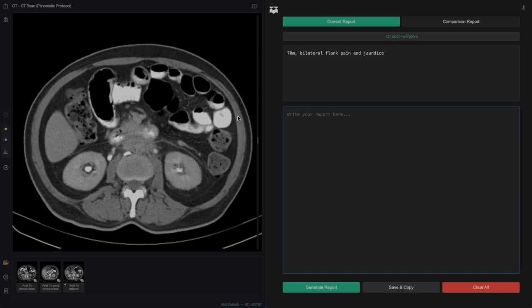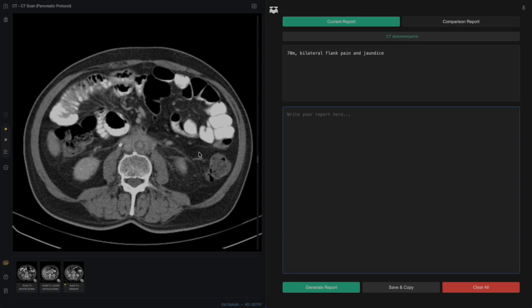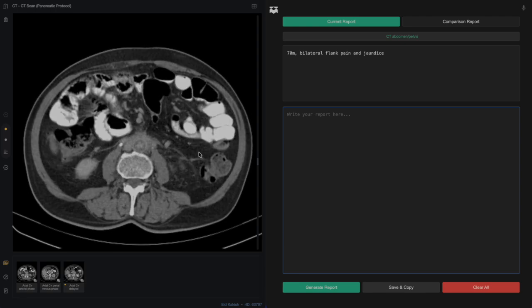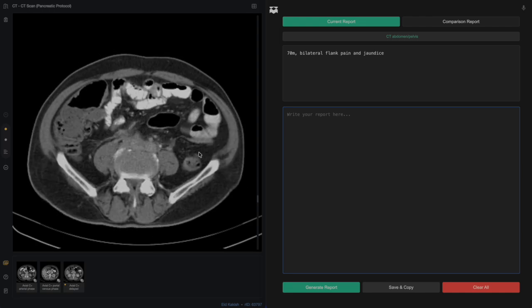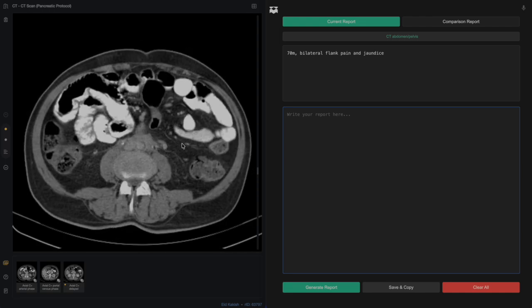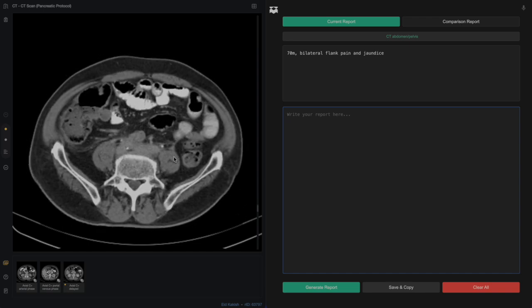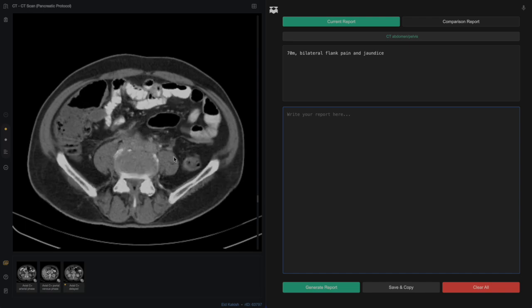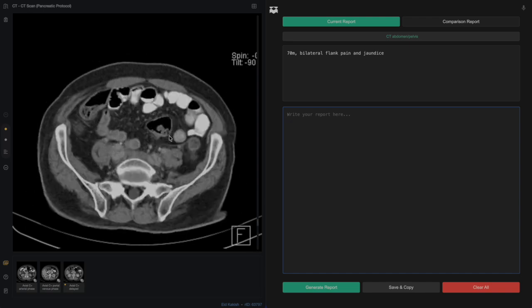As we follow the proximal ureters down, seen nicely and full of contrast, easy to spot, we can see that they are drawn medially. So scrolling up, start laterally, and they're both drawn medially towards and really enveloped by this quite ill-defined soft tissue mass surrounding the abdominal aorta. The mass continues all the way down past the level of the aortic bifurcation and down both common iliacs, and even down further towards the pelvic sidewall.